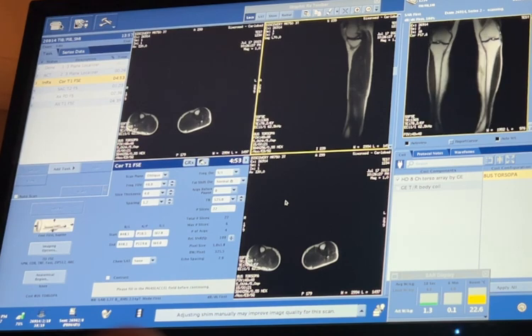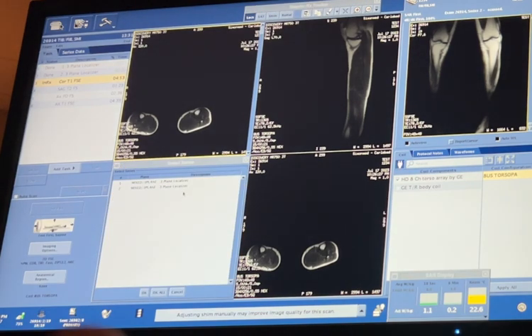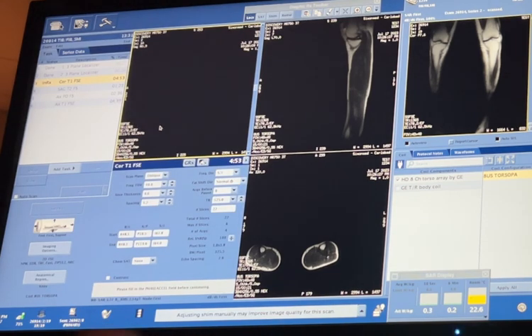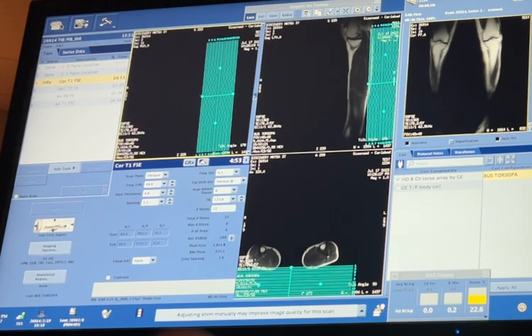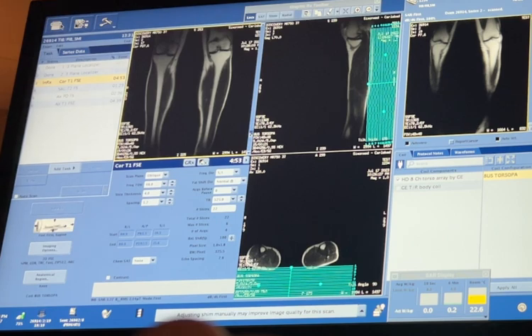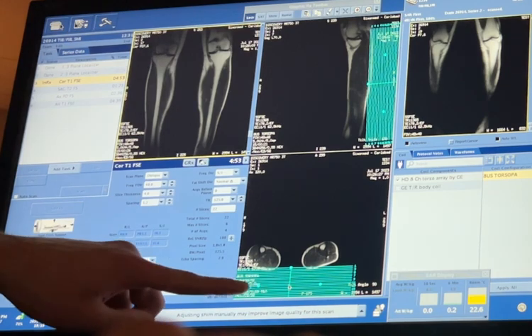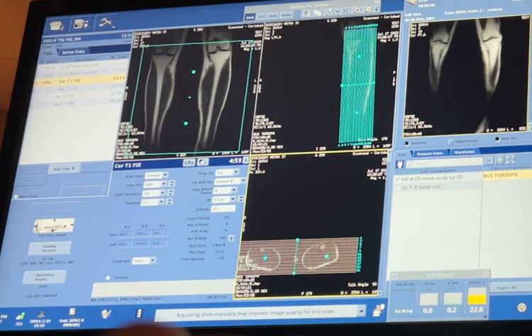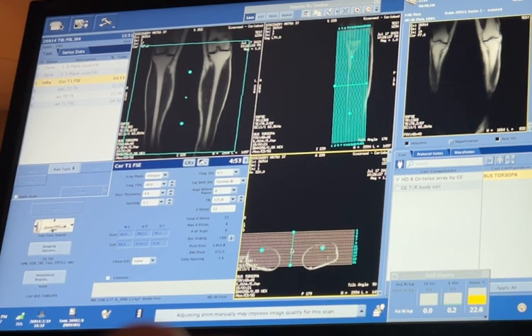There we go. Okay, so you can bring that up in the coronal plane. Second one, and then just click OK. Okay. Just OK. Yeah, there you go. So let's scroll through until we find it. There you go. So what you're gonna have to do is, we don't have a box here, but it's because they're so posterior. There you go. Ta-da. And I'm gonna have you put the blue dots right on them, and then you'll use those to angle it. Yeah. So you can angle it slightly to the left.